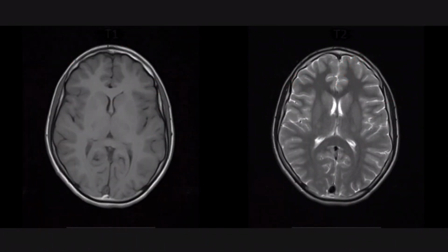Can you find out which type of MRI is this? First of all, look at the CSF part. So the CSF is here, CSF is white. So this is only T2. Okay, and you can also look at this part also. This is hyperintense, so this is white, this is gray, this is opposite to the normal anatomy. Okay, so this is the only T2 MRI.